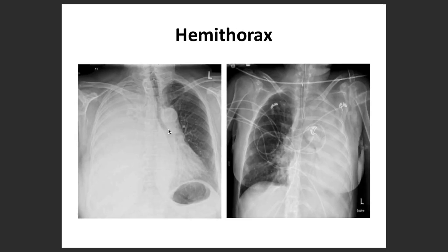So what are those three types? First, it is going to be pushed away from the opacification. For example, this is the first type. This could be a pleural effusion, a large lung mass, or otherwise a diaphragmatic hernia. That is where it is going to be pushed away.